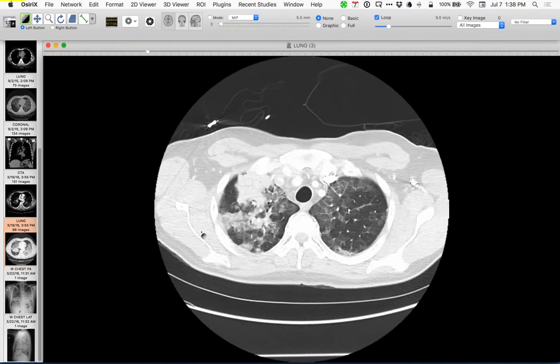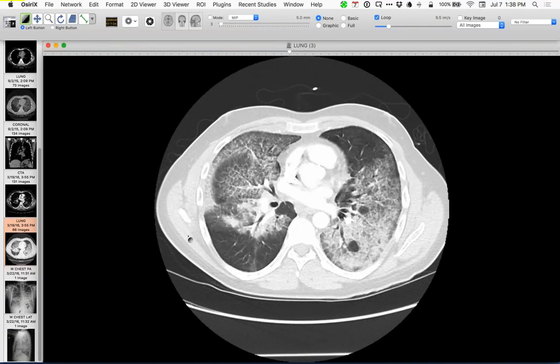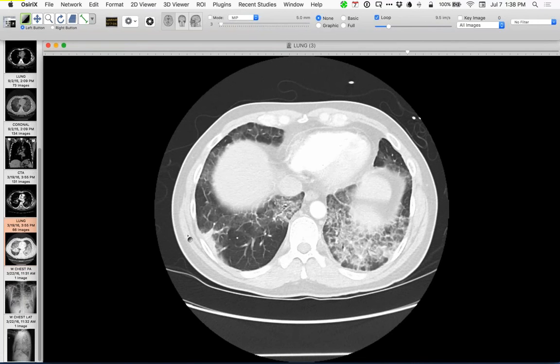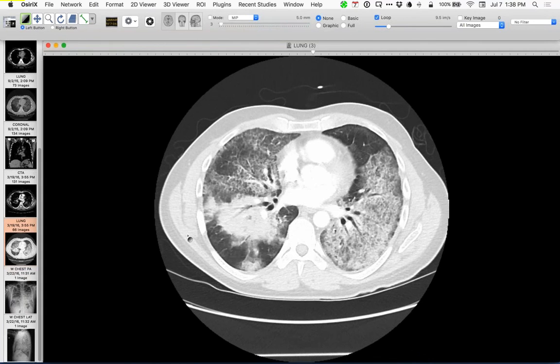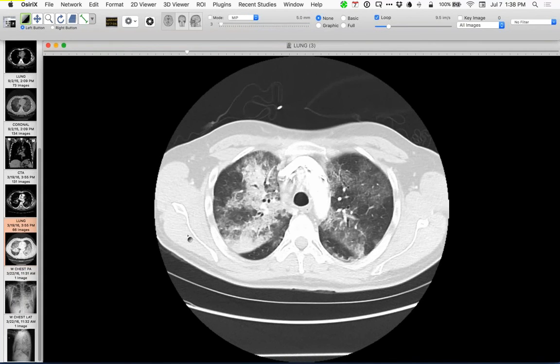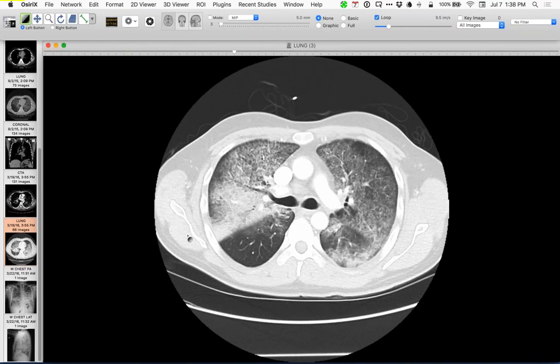As you might expect, we're going to see ground glass and consolidation, combinations thereof, and perhaps even in the right middle lobe area, down here, some crazy paving. So findings very consistent and almost typical for alveolar proteinosis. It isn't always super symmetric, but otherwise very consistent with primary alveolar proteinosis in this person.